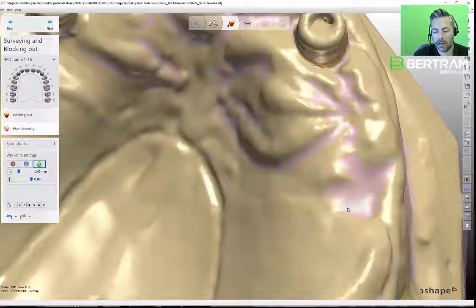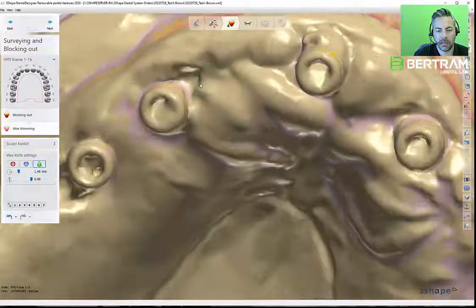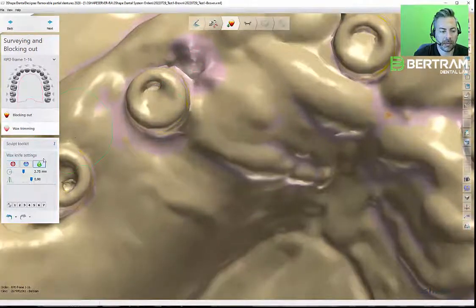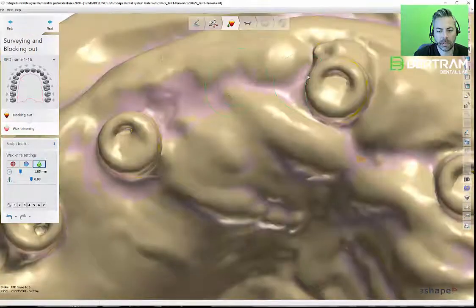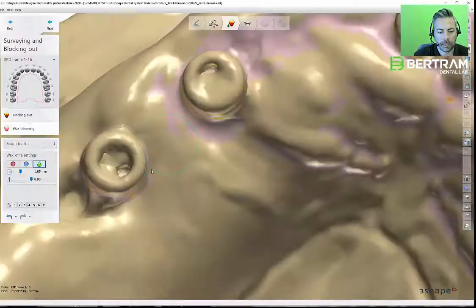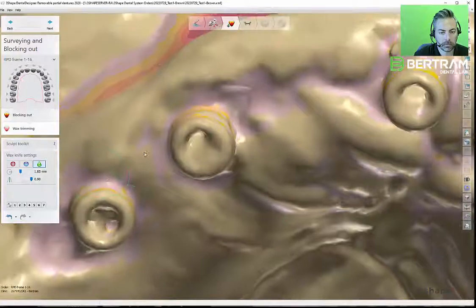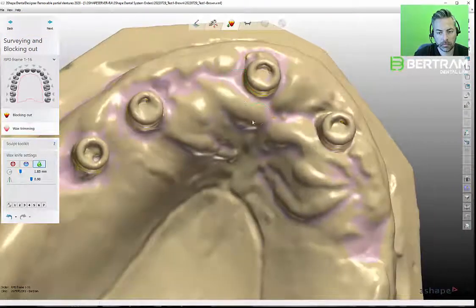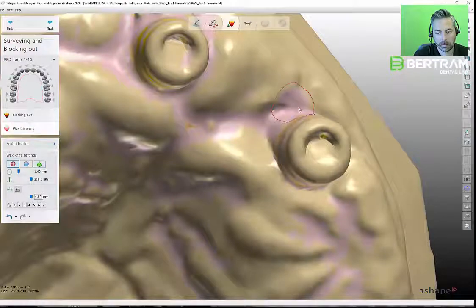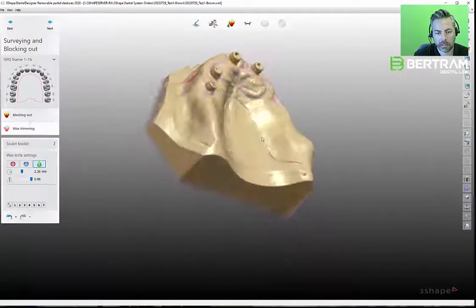I do use a gaming pad in my left hand, a product made by Razer, but as you can see in the bottom left here, I'm adjusting my intensity and the diameter of my wheel tool, applying wax here. All right, the rest of this looks pretty good.